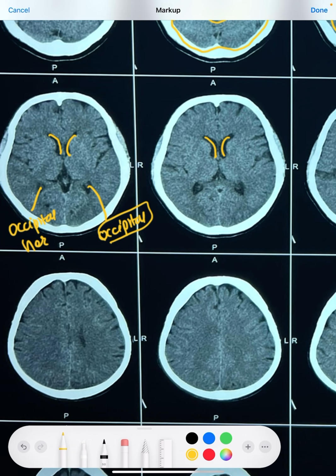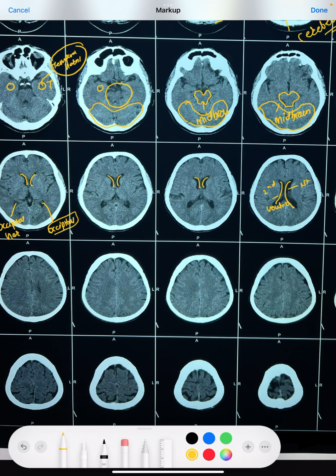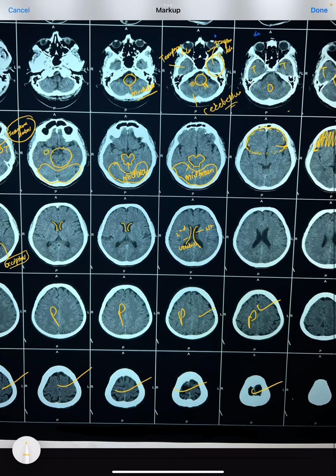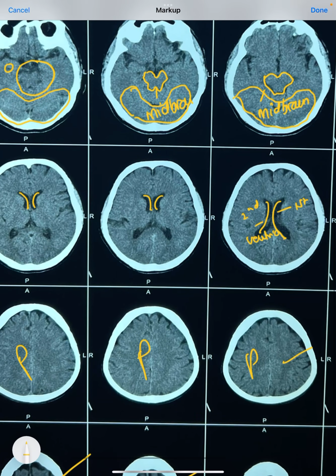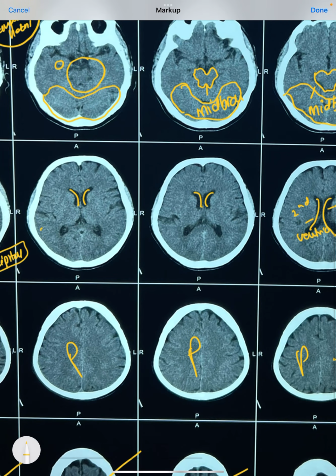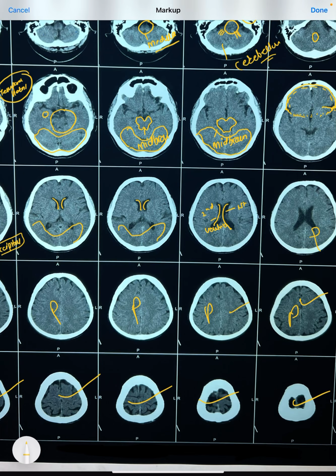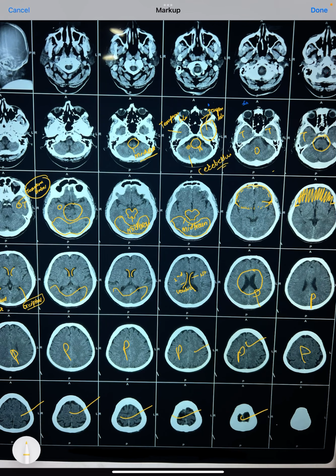Apart from that, when you are not able to see any ventricles, what you see is all parietal lobe. This is the highest or uppermost portion, and this is all parietal cortex. As you keep on getting lower, then only you can recognize the other structures. Like this is the occipital cortex. And as you go above, you can see parietal cortex only. So you can simply remember, when these ventricles usually disappear, whatever you get is all parietal cortex.